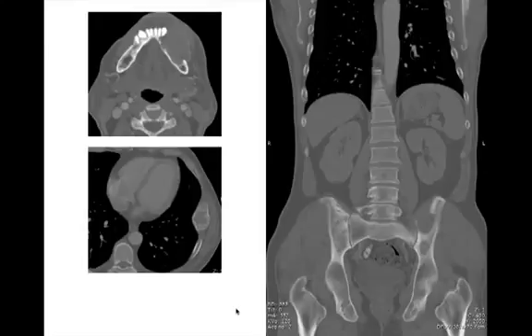And this was an older patient, so probably Mets and myeloma are going to be top of your differential. In this case, this also turned out to be a brown tumor. Patient had a parathyroid adenoma in their mediastinum, causing hyperparathyroidism, and these are all brown tumors.